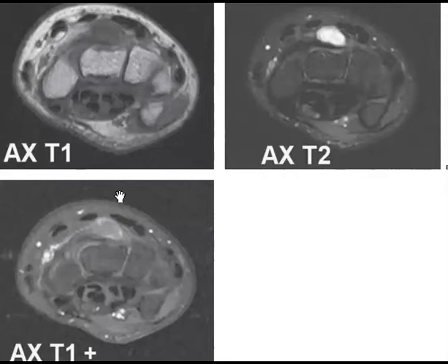The cyst will sometimes be enhancing, like what you see now, especially at its margin. Sometimes you like to differentiate between synovial cyst and ganglion cyst. Yes, Ala, perfect. The ganglion cyst is fibrous, and the synovial cyst contains synovial fluid, while the ganglion is lined by fibrous tissue.